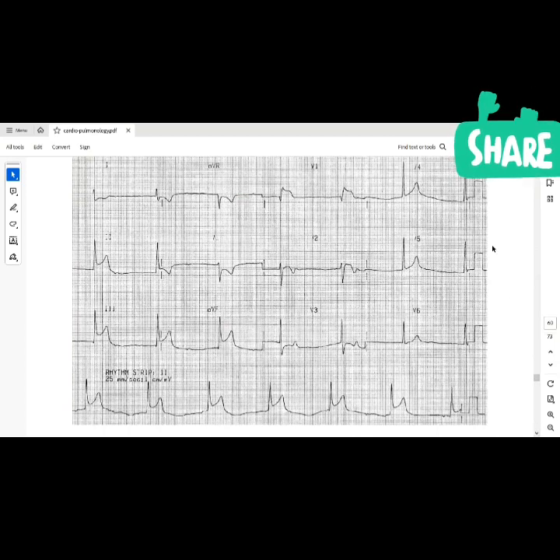All right, look at this ECG. This is an ECG of somebody with crushing severe chest pain, possibly having a myocardial infarction. So tell me the changes you see and which leads have those changes. Which ischemic changes do we see here and which leads have those changes?